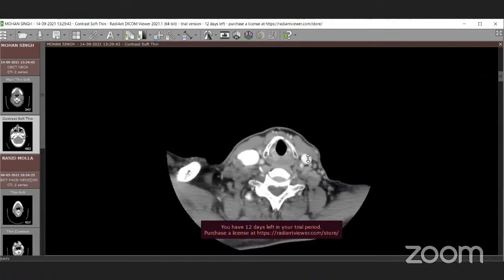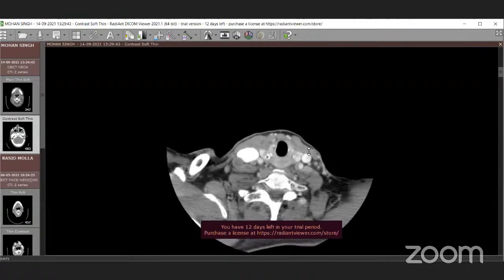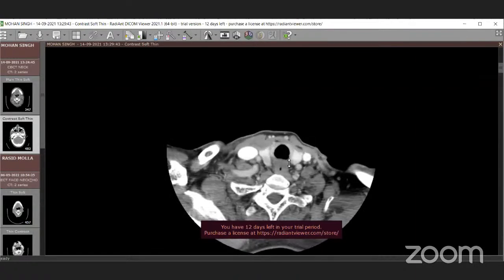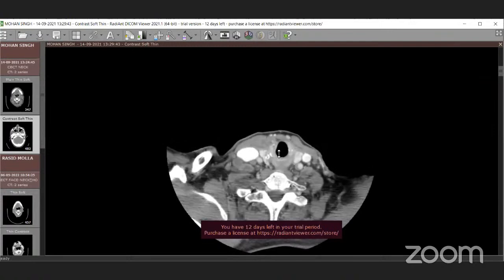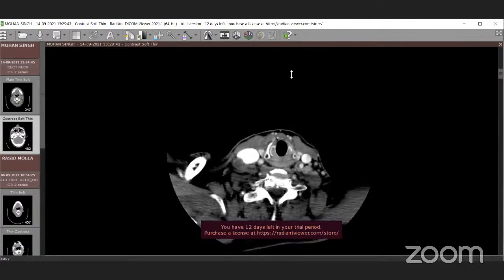Fine. So this is the inferior margin of the cricoid cartilage. I'm going down, you form the trachea. So we go from below the inferior margin of the cricoid cartilage, just posterior to this. Give me a second. Just posterior to this, the anterior portion of the cricopharynx is the postcricoid area.